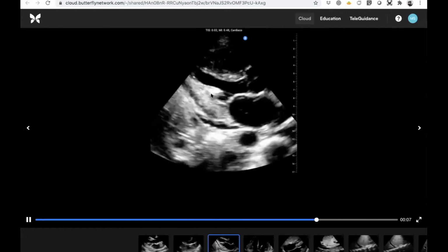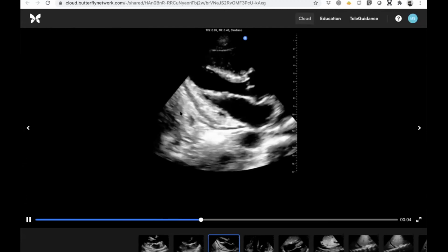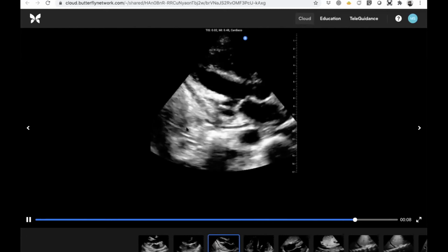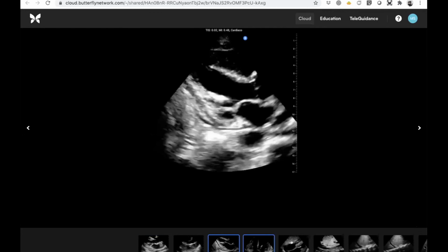I also looked at this and it seems almost like a calcified papillary muscle. I'm not totally sure what I'm looking at here. And I agree with you, I think multiple views would help. This is a great example of, you haven't seen something until you've seen it in two planes. And I would like a little bit more information on it.